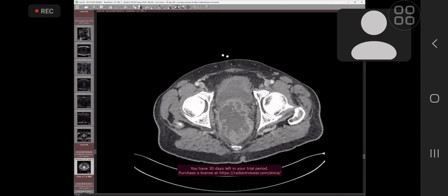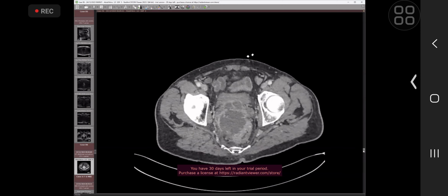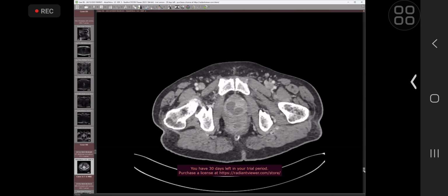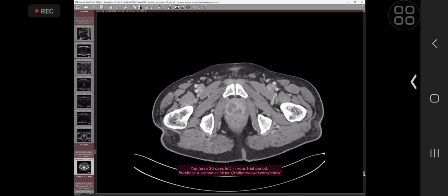The lesion is centered on the prostate, and it's compressing the rectal bowel loops posteriorly, with some involvement of the anterior rectal wall, which is pushed to the left side with no fat planes in between. There is also extension down to the periurethral location.